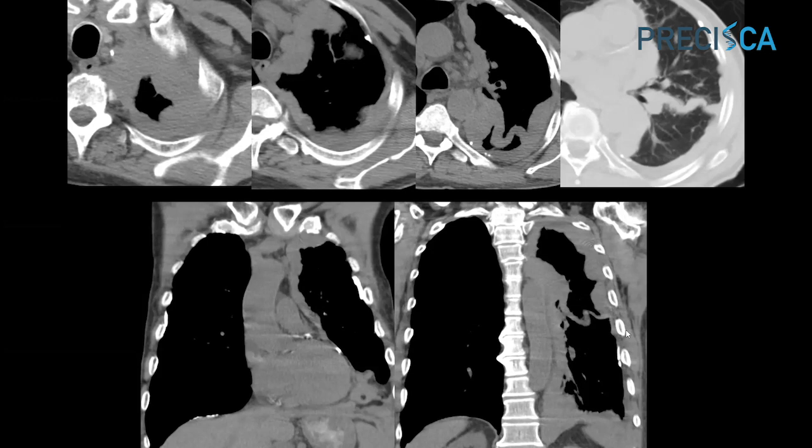But what I'd like to point out to you is that it's so important to remember that adenocarcinomas can be metastatic to the pleura. And in this case, when we did the biopsy and tissue was sent, we found that this was actually a recurrence of the patient's renal cell carcinoma to the pleura.